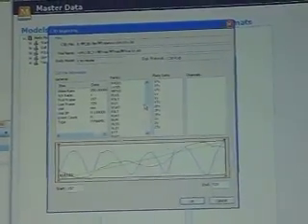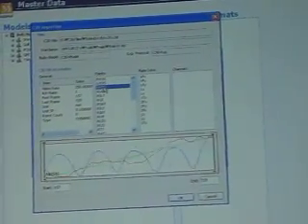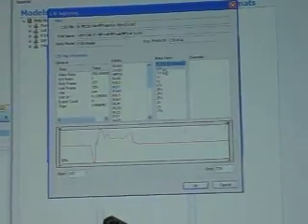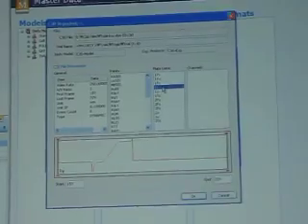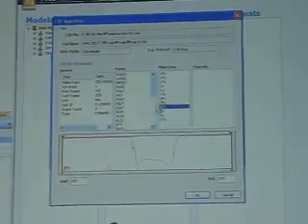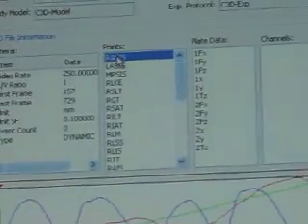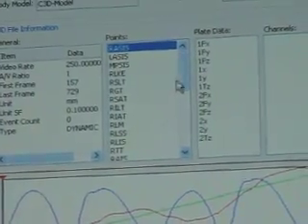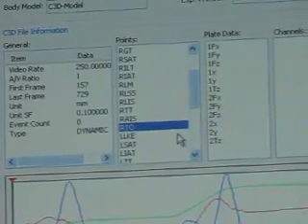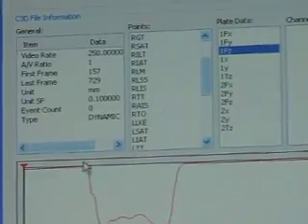This is a dynamic trial. And then right now it shows the right ASIS, left ASIS. As you select these, you will see the graph changes. Or even you will see the force data currently read from the C3D file. So the data looks okay. And if you want to include the whole thing, that's okay. Or yeah, let's import the whole thing.